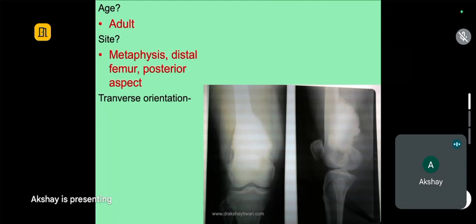So क्या होता है ना, geographic क्या है? Pattern of bone destruction है, ठीक है? जब ट्यूमर मैट्रिक्स इतना डेंस है तो आपको डिस्ट्रक्शन एक्चुअली दिखेगा नहीं. What you are seeing is a tumor matrix, isn't it? Yes. So you can omit the destruction part. You don't know how, because the dense matrix is overlying and obscuring everything else, right? Matrix कैसा है ये? Osteoid matrix. बिल्कुल osteoid है, इसमें कोई डाउट नहीं है. This is a typical osteoid matrix, and the diagnosis is an osteosarcoma.